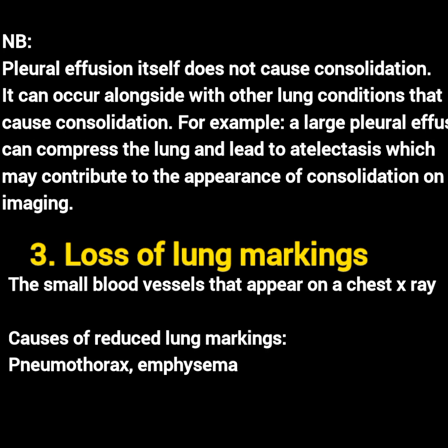Those are the small blood vessels that appear on the chest X-ray. Causes of reduced lung markings include pneumothorax and emphysema. So these are the things to look out for during interpretation of a chest X-ray.